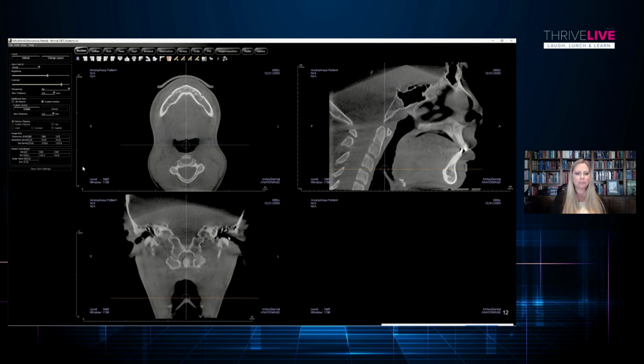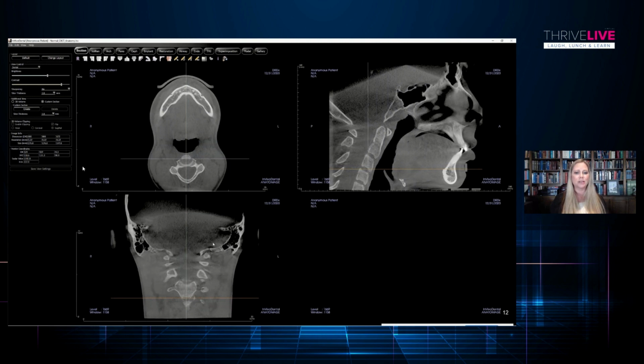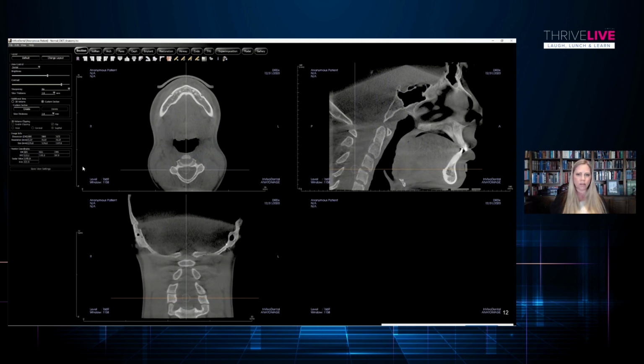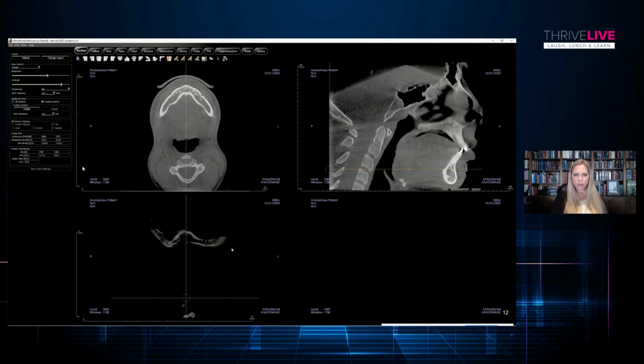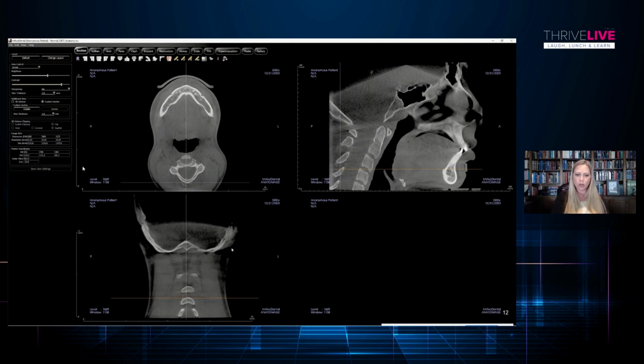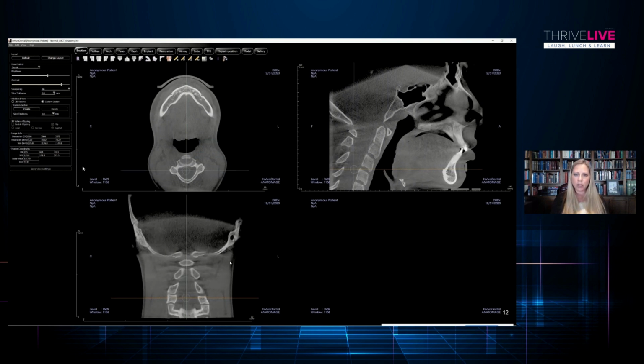It's actually coming up. We can look, of course, at external auditory canals, the ear bones, the semicircular canals, and back to those mastoid air cells. Remember, the air cells do like to pneumatize a bit, but they should, on the whole, be fairly symmetrical. So all the way back through, all the way to the posterior, make sure you view the entire volume. Then I come back anteriorly, and I'm going to pick up looking at my cervical spine.